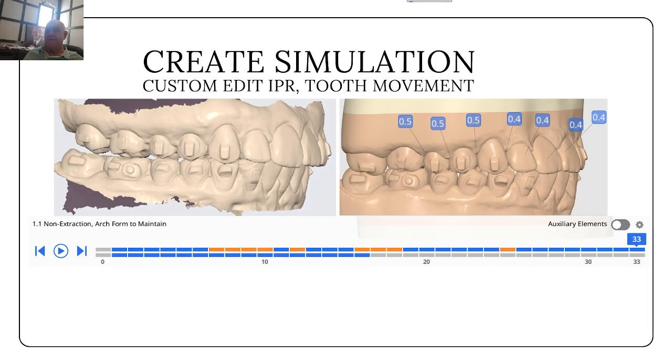Looks like about 16 lower trays, and I could order that to get what you see here. Okay, order from where? Order from Medit Aligners, which will accept this without a designer. It'll just go ahead and manufacture. Okay, so that's the way that is.